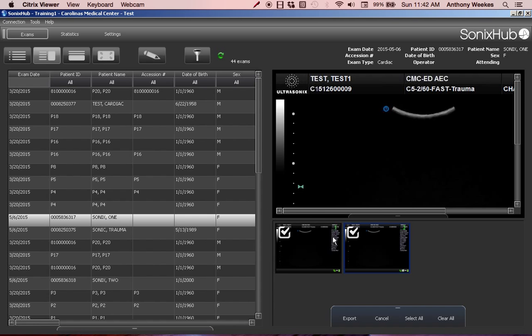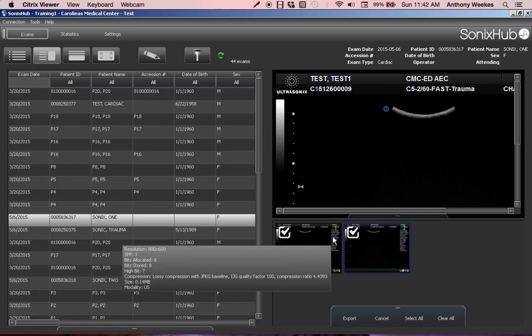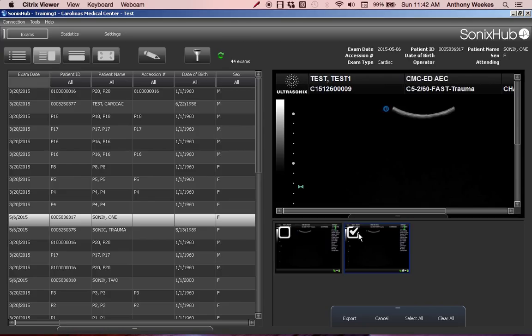It can be saved. The videos will be, I think, in AVI files or WMV files. We'll figure it out soon. You can unselect, clear all. So those are some of the things that you can do.